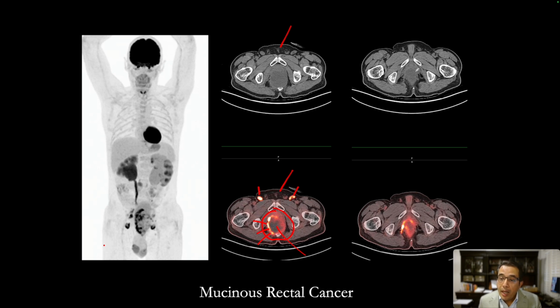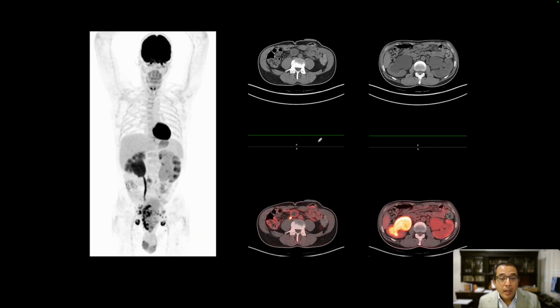And then we have this image at the level of the perineum showing again the tumor and the extension of this tumor into the right ischiorectal space, making it a locally advanced tumor, a sign that we see very clearly on this patient's fused PET CT image. Let's look at some more images on the same patient. Here on this rotating image, I want to show you this focus.